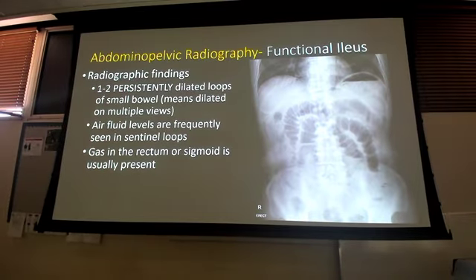Okay, so let's look at some pictures. One to two persistently dilated loops of small bowel. So now how do I know this is small bowel? Okay, step one.